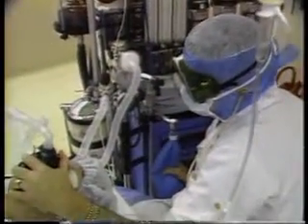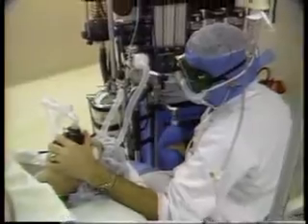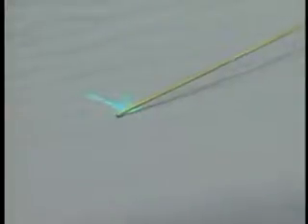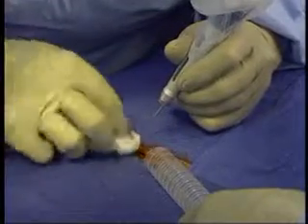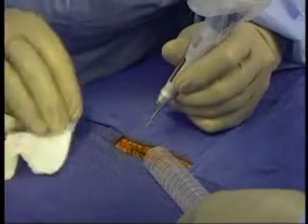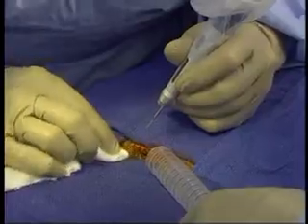The thermal laser beam is a powerful ignition source for the triad of a fire, and potential fuel sources are everywhere in an operating room. Items with the greatest potential for becoming fuel are flammable liquids or combustible ointments, gases, plastics, drapes, sponges, and endotracheal tubes. The presence of high oxygen concentrations adds to the risk of fire or explosion and leads to the rapid spread of flames. To prevent a laser-related fire, follow these safety guidelines.